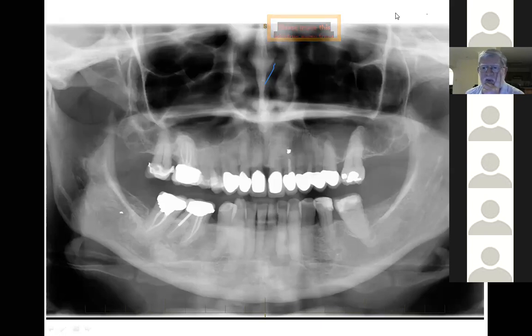Okay, fine. So that amalgam to 2-2, is it dislodged into the canal? No. This is a classical sign of an apicectomy. Looking at this, we don't have a PA. It looks like there may not even have been endo done.